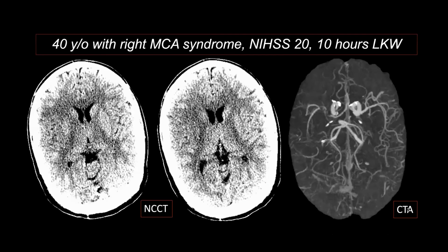Coming to diagnostic pitfalls. In the first one, we saw how we are going to do the CT perfusion interpretation. The second one, we talked about the technical pitfalls. Now we're going to put it all together and see a few cases where we're going to see what are the common diagnostic pitfalls and what are some of the pearls. The first pitfall, over or underestimation of predicted core. Let's start with this case.